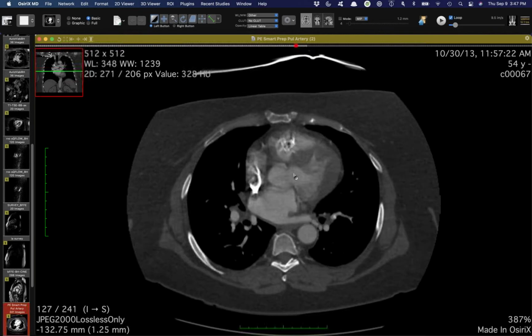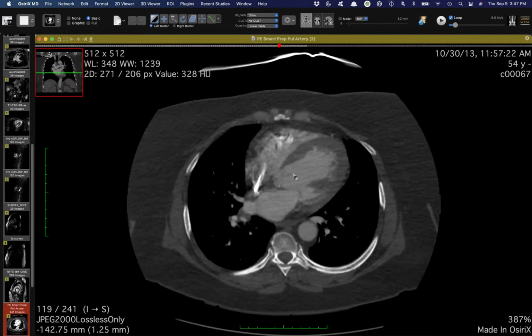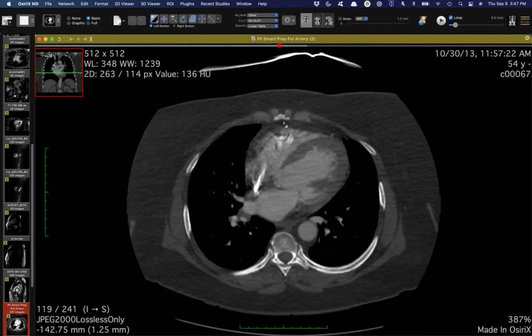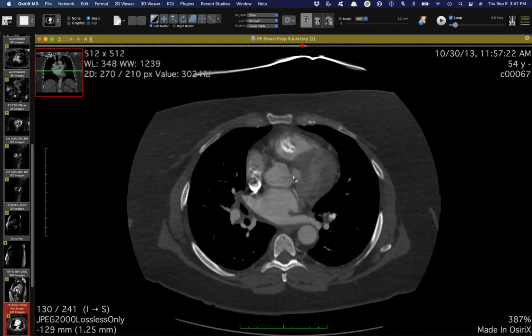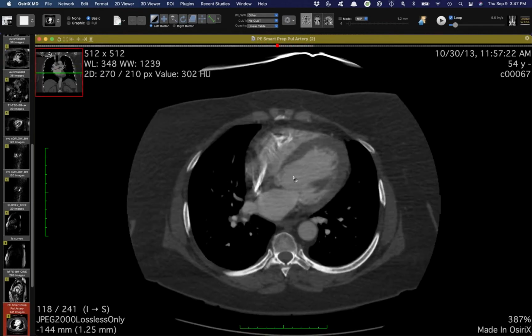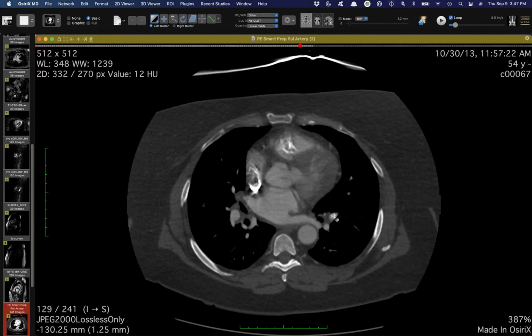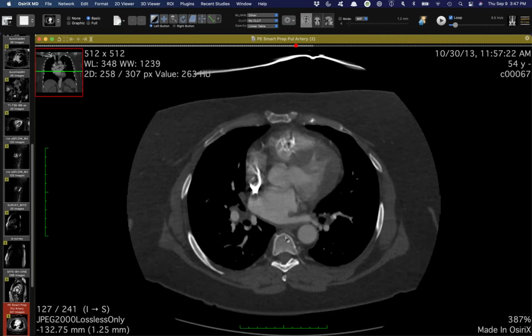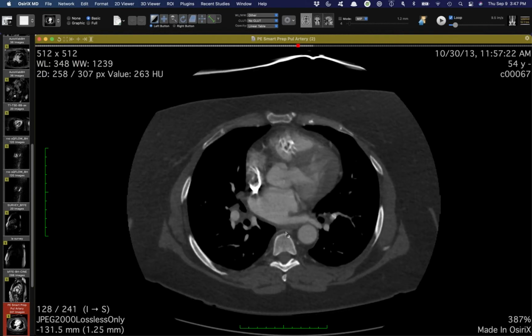And I saw one that was in the left atrium because it was a case report just discussing a TIA that a patient presented with because of this. But this was the other CCAT I had, basically just a fancy term for calcified thrombus. And this one had embolized as well. Yeah, so I'm just reading, and this is pathology, basically saying it's calcium mixed with chronic degenerating blood elements and inflammation. I mean, what else?